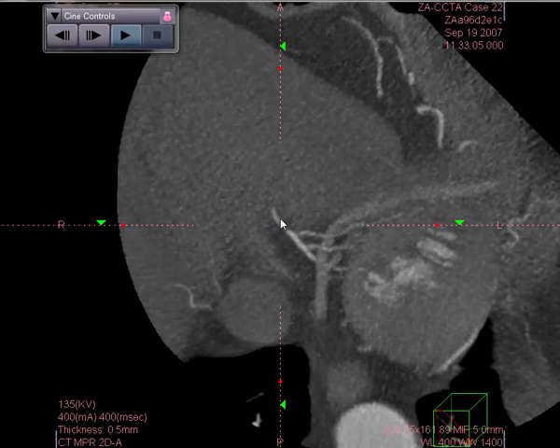Given the fact that this patient has clearly occlusive disease of the proximal portion of the right coronary, this is consistent with collateral flow. So regardless of the fact that this is a very difficult study to read, you need to focus on the main picture here. This patient has significant advanced triple vessel obstructive occlusive disease and needs to go on for further evaluation, including cardiac catheterization, to better map out these areas, and then an intervention. Likely, given the extent of disease, this patient would be probably a better candidate to have coronary artery bypass grafting.